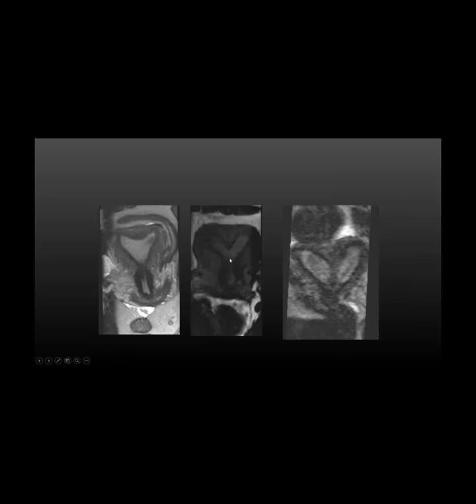And sometimes this septate uterus is a complete septate, like the septum goes all the way to the cervix. And in those cases, some people may confuse it with a bicornuate or a didelphys. But again, the important thing is to look for the external fundal contour. If the fundal contour is preserved, it's a septate uterus. And then in bicornuate and didelphys, you get this fundal dip. I mean, there is no upper convex fundal contour. So if you see a dip in the external fundal contour, then you're thinking of bicornuate and didelphys.